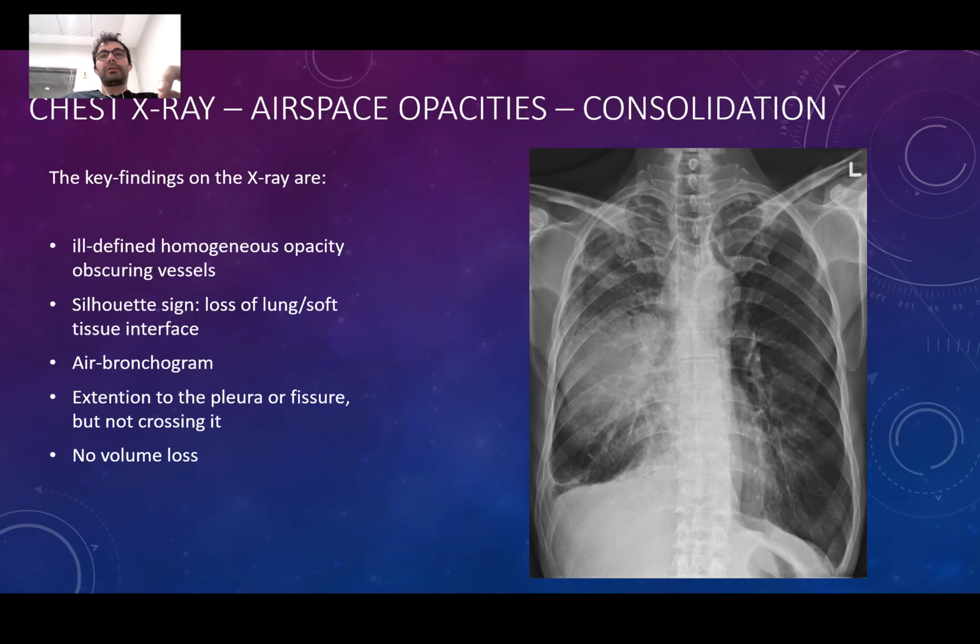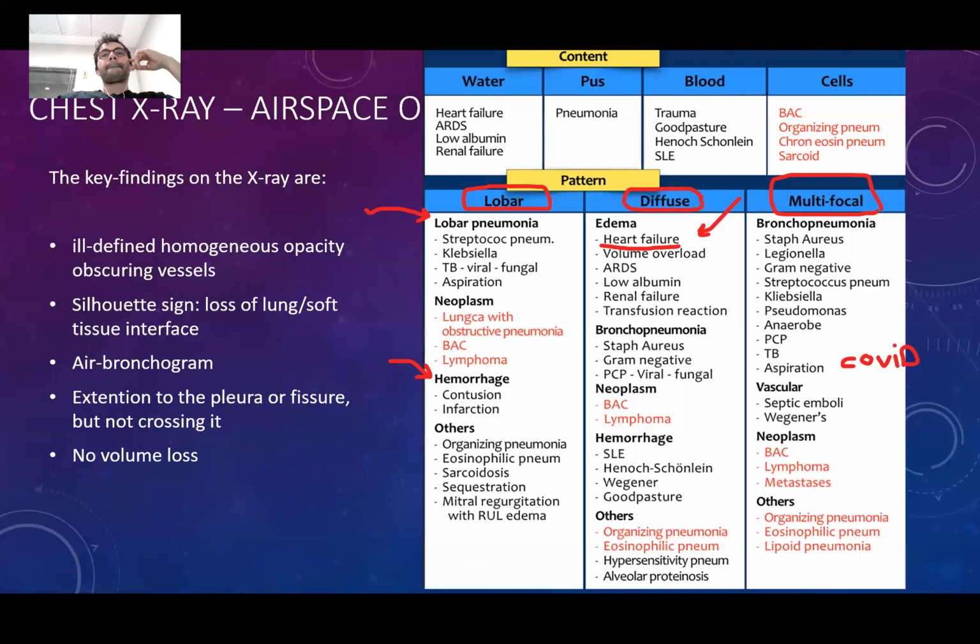Also, I'm seeing some pleural effusion here, right? And the lung has gone upwards, the hemidiaphragm is elevated. This is a typical case of pneumonia, for example. A very big area which is infected, which also caused effusion because of the inflammation.